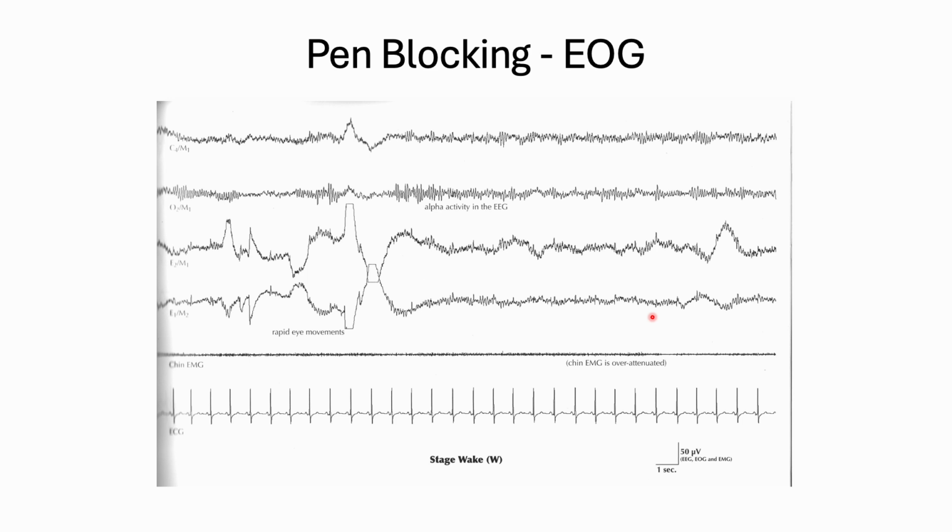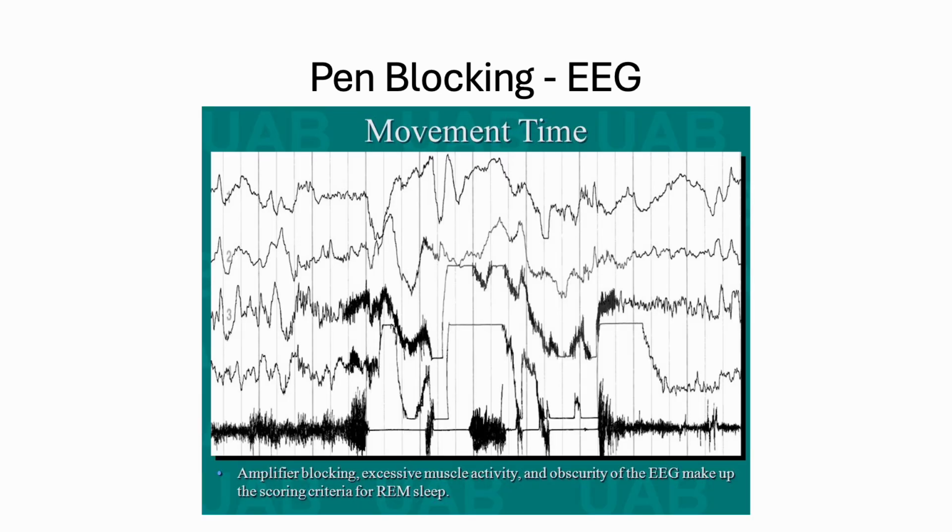Other than that, this looks like a pretty clean looking record. There might be some EKG artifact, little tiny blips there. The heartbeat's very regular, usually. And when it's regular like that, you can pick it out pretty quickly.